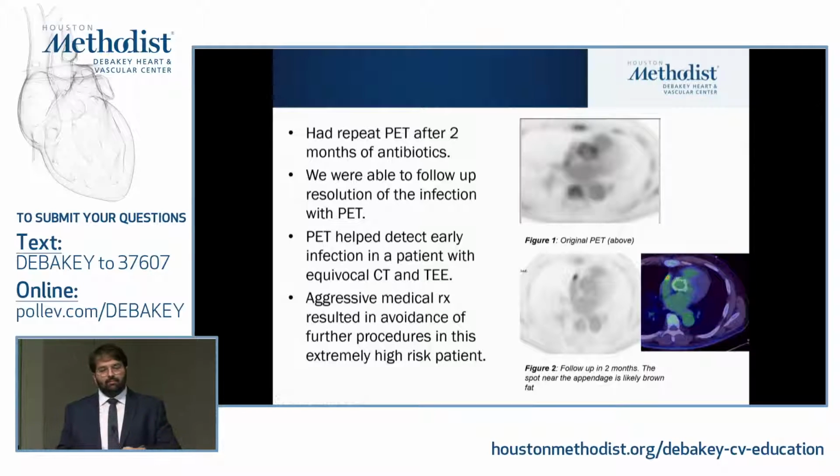And I'll show you examples later on, in a few minutes, about the difference between smooth or inflammatory uptake and infectious uptake. But it's gone in the second one. Sorry. Well, a lot of this is based on how the images are leveled as well. You can kind of see it here. So you can see a little bit of uptake in the vertebra here and here as well. Yes.